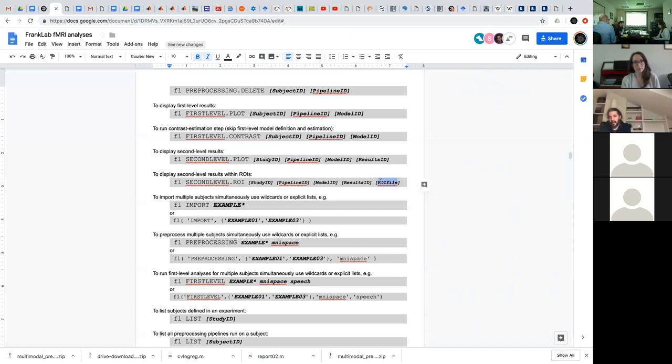The only problem with this type of ROI definition is that it is categorical. A voxel either is or is not in a particular ROI. If you want something like a weighted ROI definition, then you want separate files per subject, because it's likely that a given voxel is going to have different weights for different subjects.